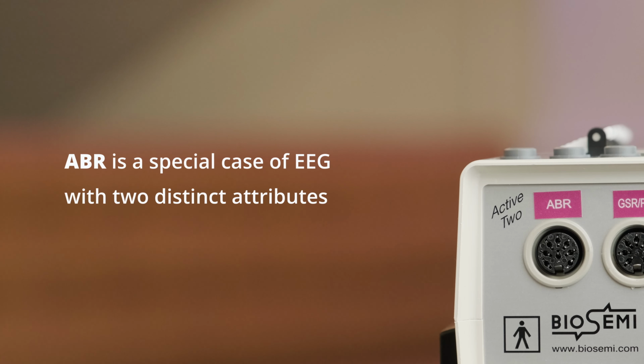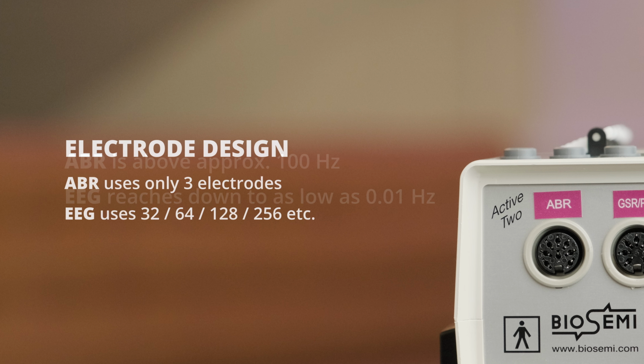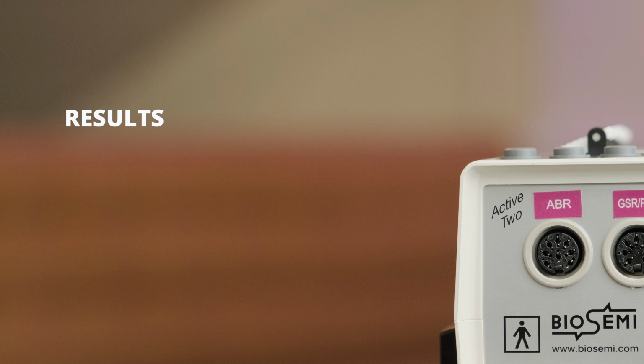ABR is a special case of EEG where we see two distinct attributes. The ABR information is above approximately 100 Hz, whereas the EEG information reaches down to as low as 0.01 Hz. The ABR design uses only 3 electrodes, whereas EEG uses tens or even hundreds of electrodes. These two attributes allow the designer to optimize performance by making different trade-offs for the ABR channels.